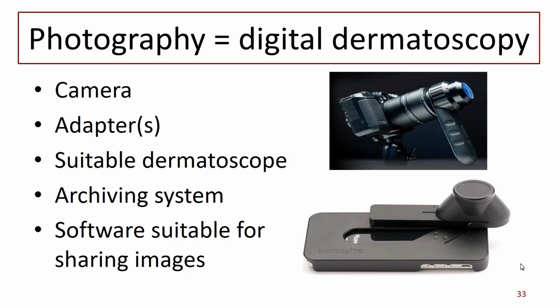So the DL1 that you hold normally, when you convert it to photography, you add a spacer. So it goes from a non-contact to a contact device. It's easier to demonstrate when you've got two. And those actually join on just by a magnet, so you just join them together. Very easy. And then you need software in order to display it.